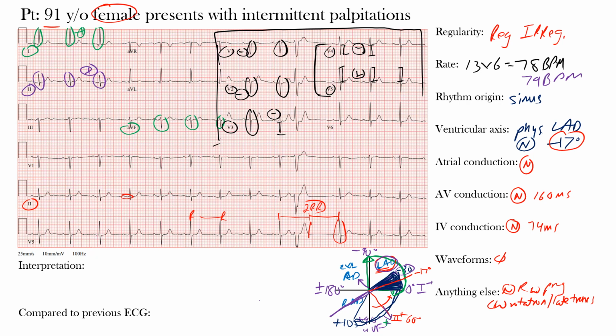Now, in terms of clinical significance of this, they're often benign unless you have a prolonged QT, and that can lead to torsades, all right. You typically don't need treatment with these, and you may have palpitations associated with them, and that may trigger a reentrant tachyarrhythmia. Now notice that our patient here had palpitations, and that does make sense that we are seeing this PVC here. Maybe if we had more of an EKG or had a Holter monitor, we might see a few more when she's experiencing those symptoms.